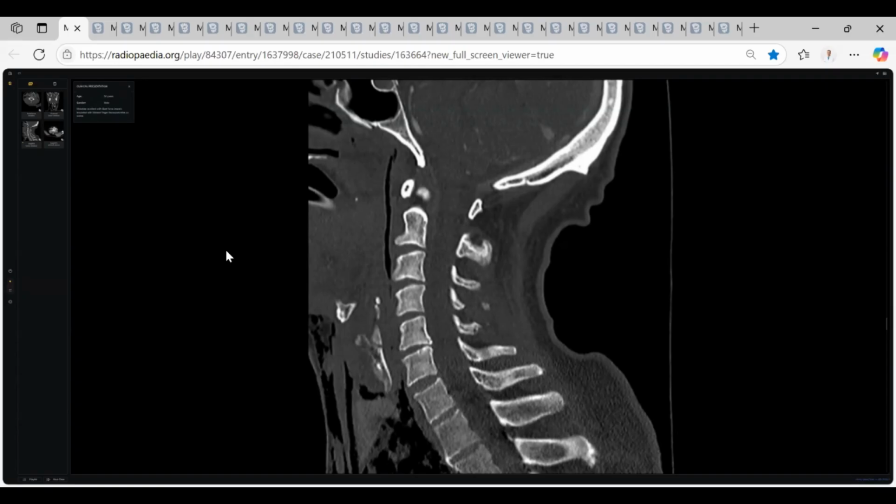See, I stopped when the examiner stopped at one slice. What he wants is in this slice, and he wanted to save time or guide you. The most important pathology for this case is in this slice. Okay, I can see there is some retropharyngeal soft tissue thickening.